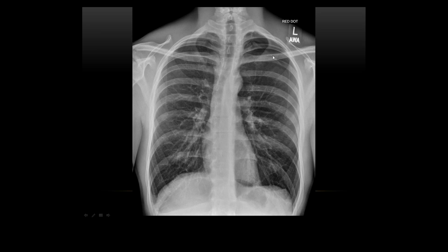There's actually a pneumothorax. Can you see that very, very thin line there? And then distal to that, there are no lung markings whatsoever. Can you see here, there's all these lung markings, and as I come past that, it's just very black. So they've got a left apical pneumothorax.